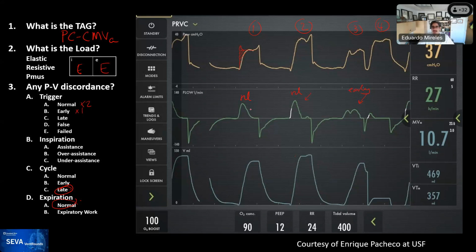So that's why from this one to this one, the pressure is higher, and I think that's what happens on this one. And we have seen this when we are on auto mode too, that you have a small breath and then a big one, and I think that's exactly what happens here. This breath is being commanded by this one, so this one set for the next mandatory. This one set it for this one. So breath number 1 commanded breath number 3 because they are mandatory, and breath number 2 commanded breath number 4 because they're patient triggered.